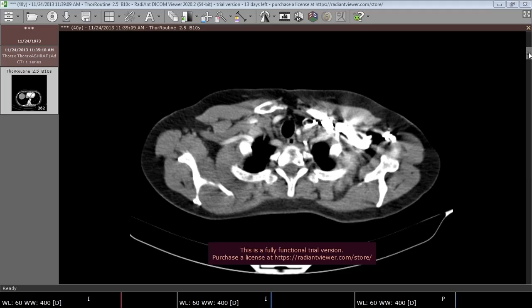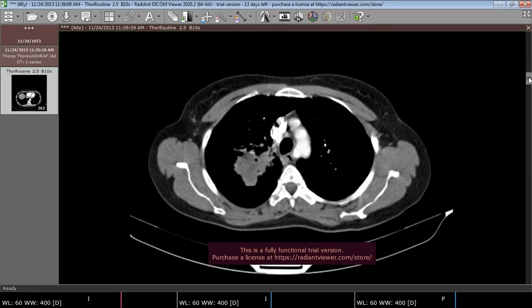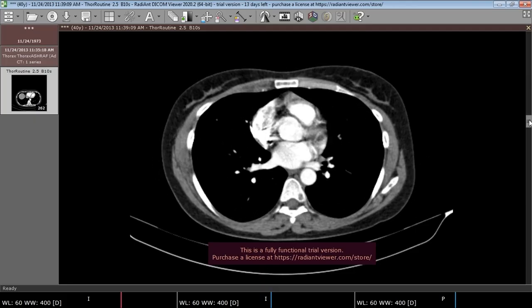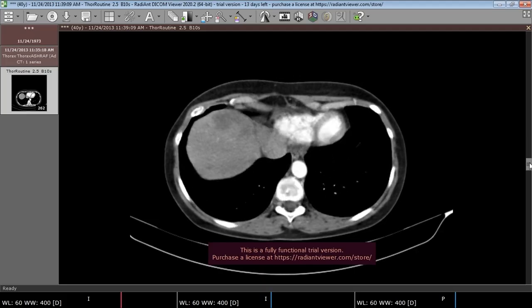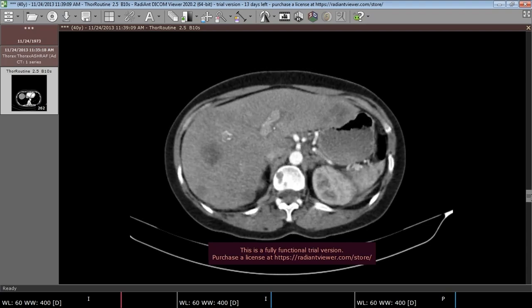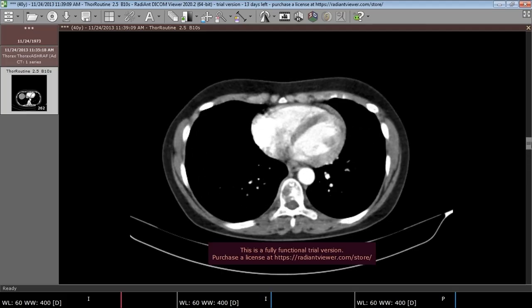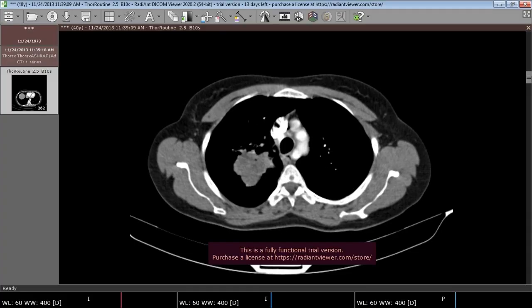Case number 1. We will review the case first. Actually, it is a simple case. The diagnosis is simple and easy for any radiologist, but here we can learn how to evaluate such a case, search for findings and report them.